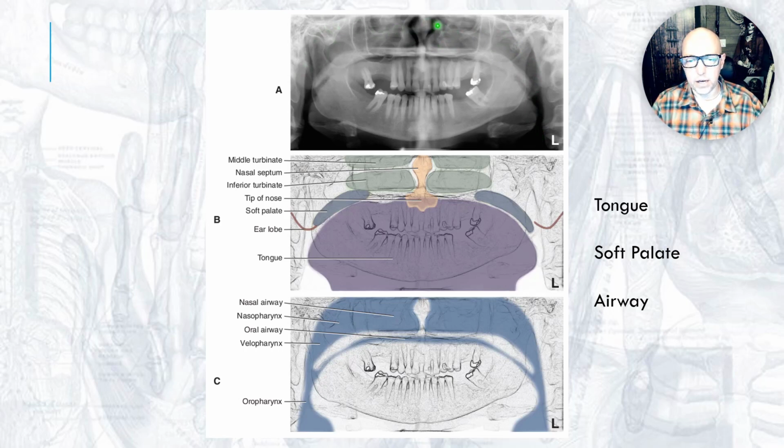And so you follow the nasal cavity back. Now we're just looking down here, the relative radiolucencies, because we're looking at air spaces. That nasal airspace leads back above where the soft palate is. Here you have your nasopharynx, and then below the palate line you have your oropharynx.